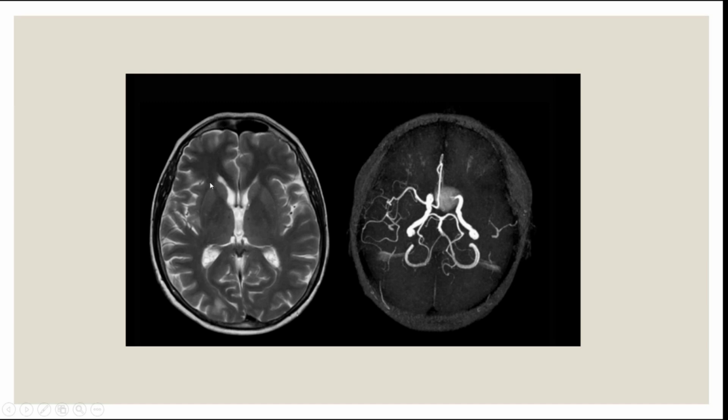So this is a normal MRI. To the left, T1, no, T2, because water is white in T2. You can see the hyperintensity in the ventricular system. So if you're looking at this image and you're trying to think if it's CT or MRI, because sometimes I confuse them: in MRI, you don't really see the bone, the skull.